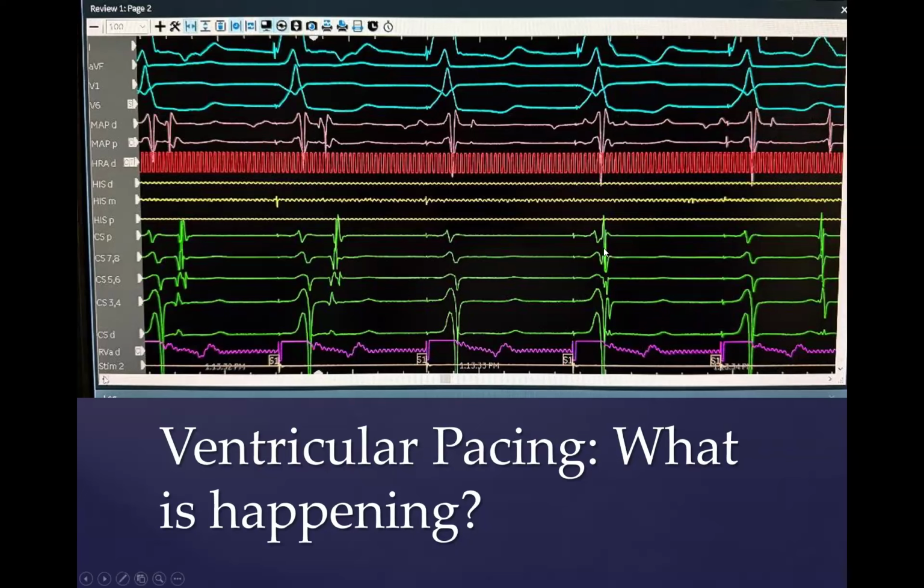The other thing that's interesting is that the relationship of the A's to each other is a little earlier in CS proximal out to distal. In these beats going up the pathway, it's a completely different relationship, right? So these are sinus beats that are just happening randomly at a relatively slow rate while you're pacing the V at a faster rate.